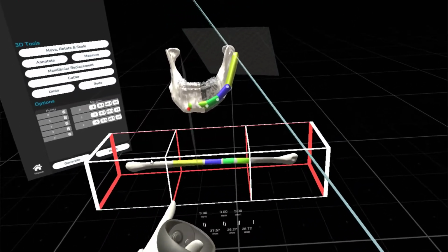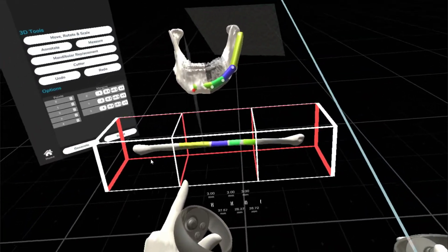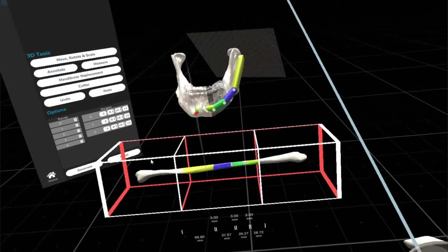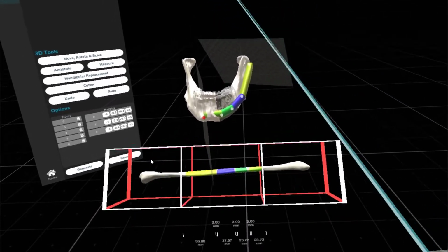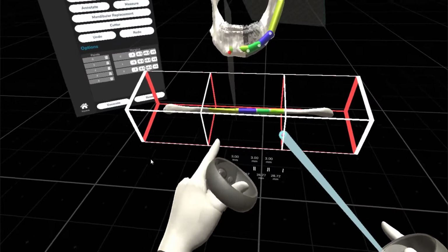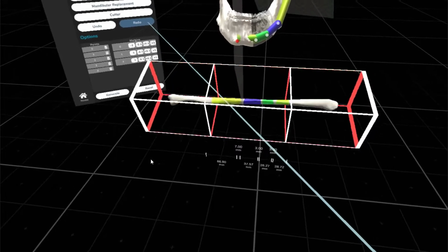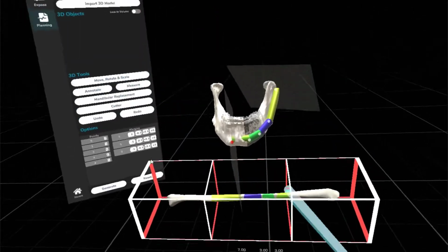So whilst we're in this stage, there's a few things we can do to modify the positioning. First of all, you can use the up on the right hand joystick, and that will simply let you rotate and manipulate the fibula bone. It doesn't modify any of the actual bones themselves, it just lets you look around it. Which in this case will be used for, say, maybe these two here are a little bit close together for my liking. So we'll go ahead to the intersection and just bring a bit of spacing in those, and we'll have another look around and think everything else looks pretty good for it.